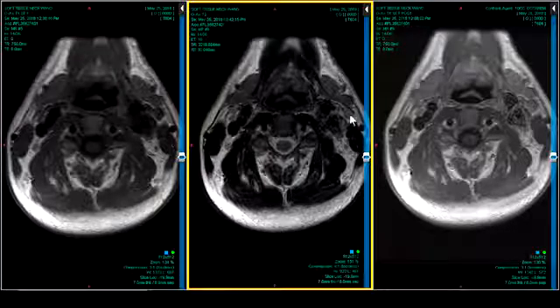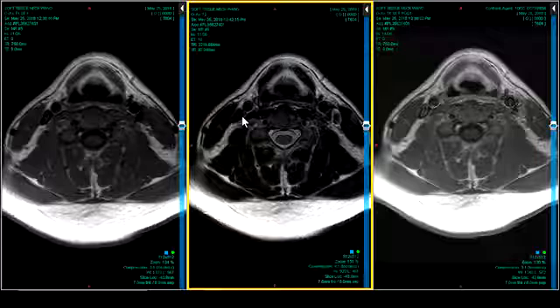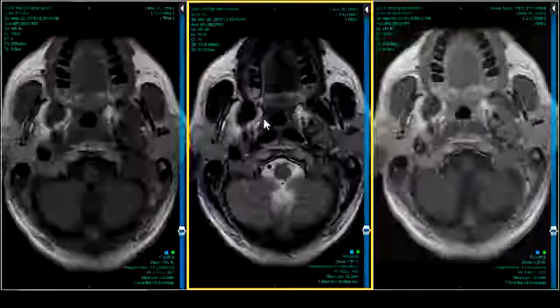Got a couple of nodules here. They look more like lymph nodes than anything else. What else do they get? They get adrenal lesions. So you might have to check the adrenal glands, anything endocrine. But the one big one that you don't want to miss is medullary carcinoma of the thyroid. So let's see if he's got that. I mean, you might not think to look for it.